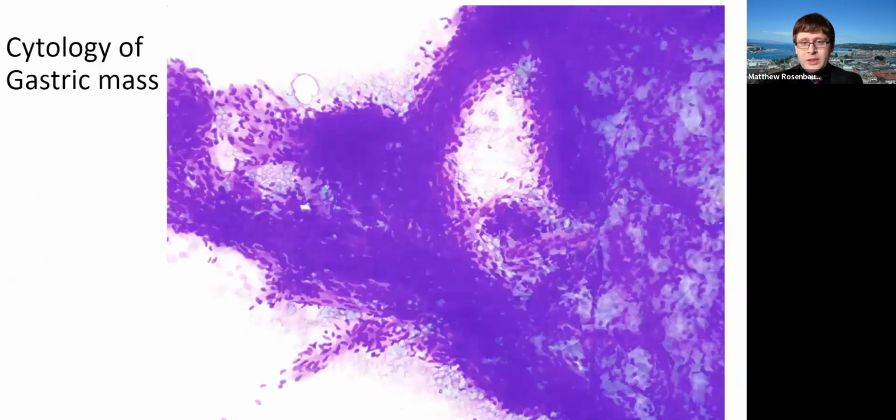They did endoscopic evaluation. They don't often do cytology on this one, so it's very rare that we actually get good cytology on it. So when we do, we try to get good photos. Here are photos courtesy of my colleague, Helen Wong, at BIDMC. Basically what we see here is a highly cellular, very cohesive neoplasm. This kind of cohesion isn't generally what you see in adenocarcinomas. As you get towards malignancy in epithelial cells, or of course in lymphoproliferative disorders as well, you get very discohesive populations. It's not to say you can't have cohesive ones as well, but this is very cohesive, which makes you think it probably is some sort of stromal or mesenchymal tumor.